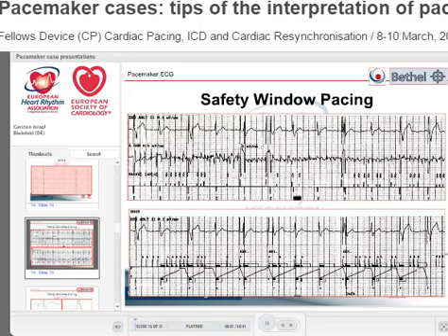I think there should be some more pictures on this. Here you see better that there's atrial fibrillation. This is the atrial electrogram with lots of fibrillation. And here you see this funny behavior, spike, QRS, spike with narrow AV. That's the typical situation. And down you have even what I love very much in older Medtronic devices. You see that there is this so-called ladder diagram. This is how the device thinks. And even it tells you here safe. So inappropriate ventricular safety pacing, atrial undersensing, typical cause.